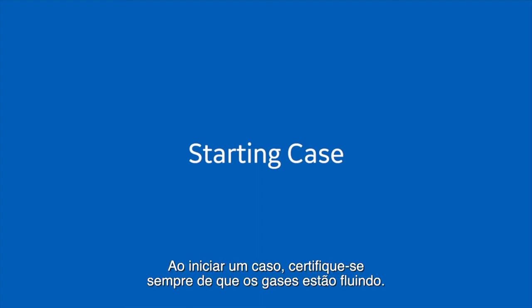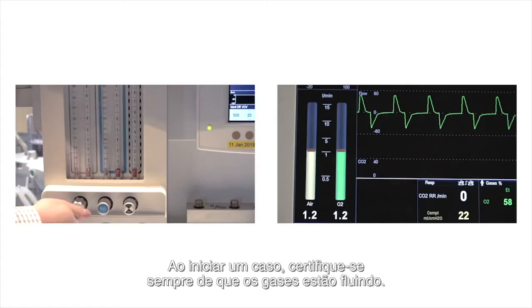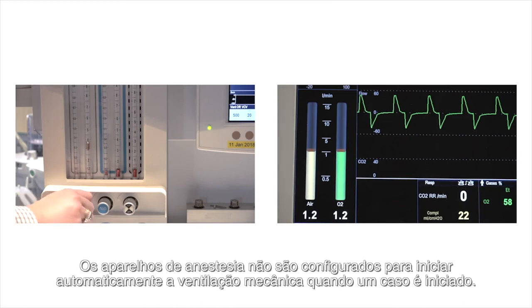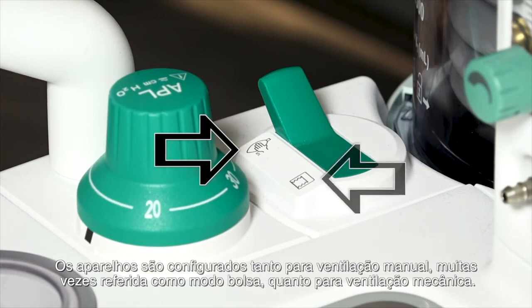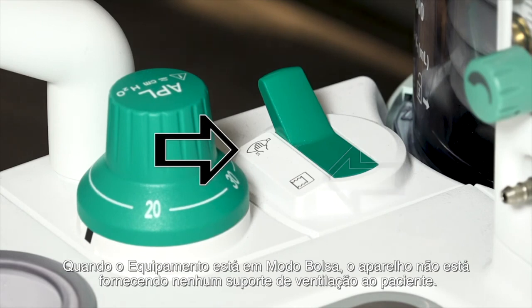When starting a case, always ensure gases are flowing. Anesthesia devices are not automatically configured to begin mechanical ventilation when a case is started. The devices are configured for both manual ventilation, often referred to as bag mode, and mechanical ventilation. When the device is in bag mode, the device is not providing any ventilation support to the patient.